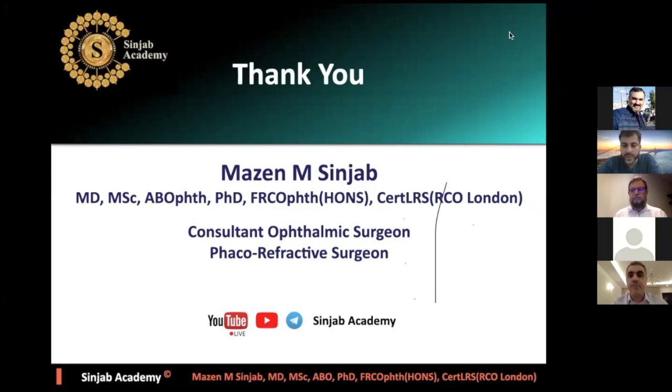Well, thank you very much, Dr. Mazen. I noticed that you pay attention to the anterior elevation and the posterior elevation. I noticed today that you focused too much on these 2 points. Yeah. If there is anterior elevation and posterior elevation, and there is no corresponding thinning, for example, think about this case. Actually, if you see no correspondence between the maps, there must be an artifact or a pathology in the cornea. So you have to check the cornea.